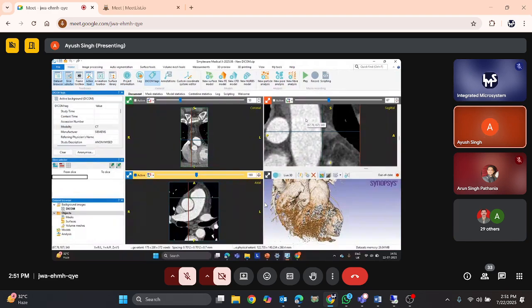This is the most important step to learn. Why? Because once we are familiarized with the coordinate position and the grayscale range, if we are dealing with any biomechanics application like placing an implant, it plays the most crucial role in placing the implants accordingly. We also have custom coordinate systems at data site.